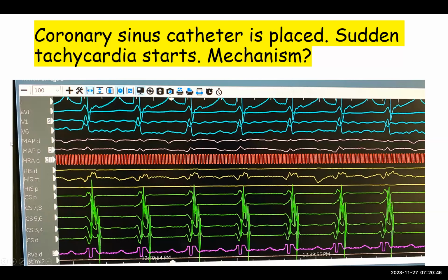And I didn't do that at this point in this procedure, but that is a possibility. So when I saw this in the case, I had a suspicion that this was probably AVNRT. I believe in this case, it was ultimately determined to, in fact, be AVNRT. But that had to come from multiple other tests. So you see that we would not just go ahead and do a slow pathway ablation based on this finding alone, because we still don't really know definitively what the patient has. And of course, you don't want to be burning near somebody's AV node unless you're pretty darn sure you have the right diagnosis.